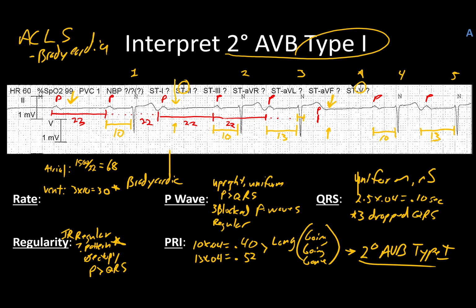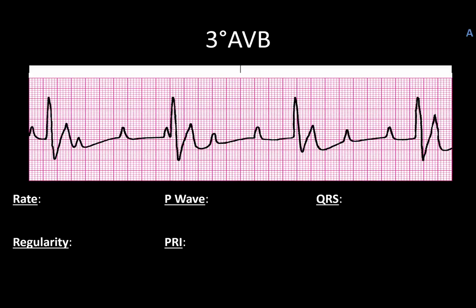But again, treat the patient, look at the patient. That's what matters. And that's honestly more important than the rhythm they're in. The rhythm helps you decide what type of treatment they need. All right, 6-second strip. We've got 1, 2, 3, 4.